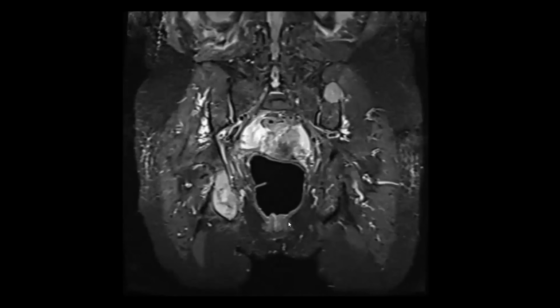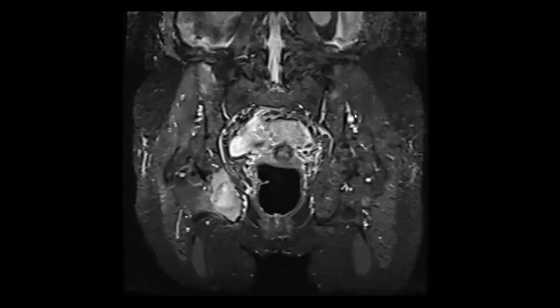There is one lesion on the left iliac bone. Okay, so conclude the case for me. Multiple bony lesions, destructive bony lesions, highly suspicious for metastatic bone deposits. I would like to convey my finding, do a malignancy workup, refer to the oncology MDT meeting, image-guided biopsy, histopathology, and staging.